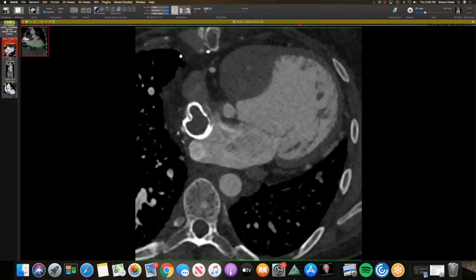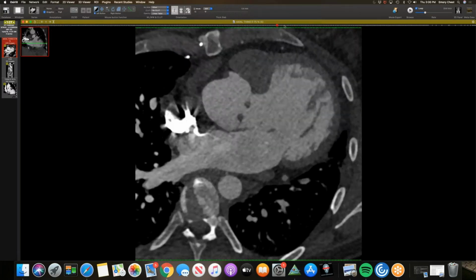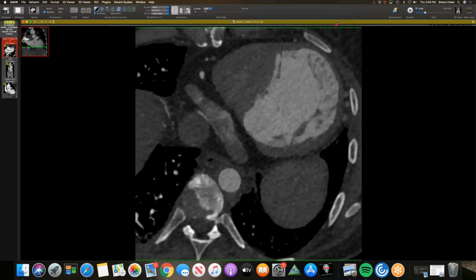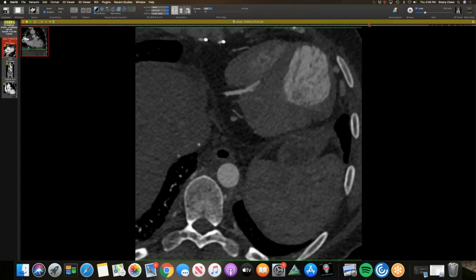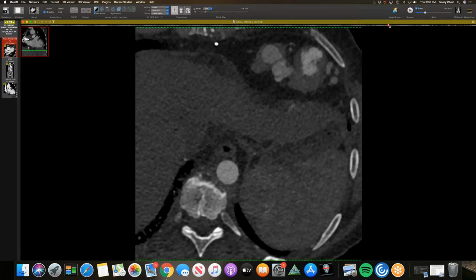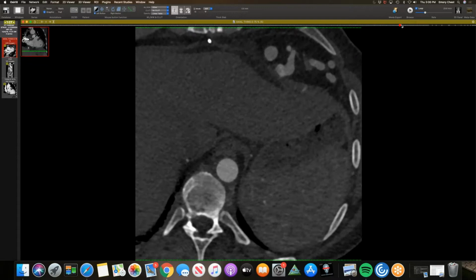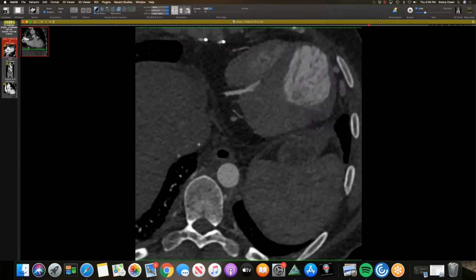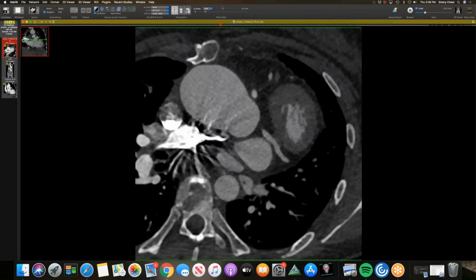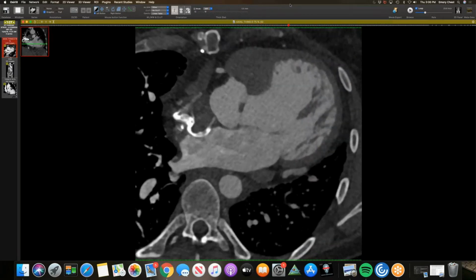And you can see the very dilated left ventricle from the insufficiency. And then the incidental thing that I saw on this, which they didn't know about, was as I scrolled down, you see this dilatation here of the RV apex, and so you also see these dilated vessels here. So this is actually, if you track them, a fistula, a cameral fistula between the obtuse marginal artery and the right ventricle.